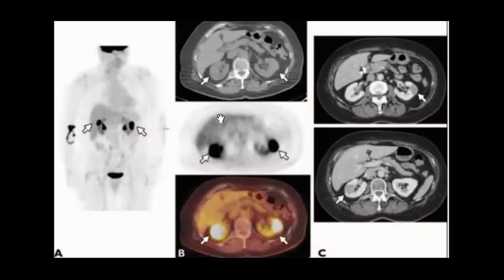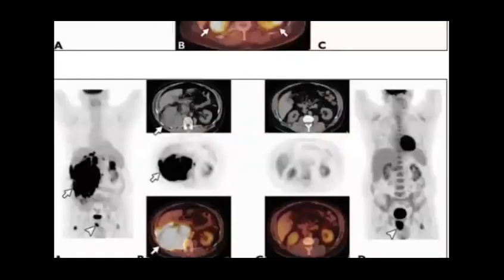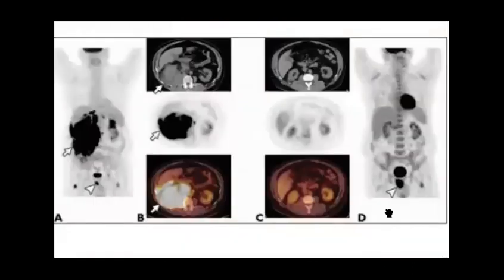Yeah, if you take a biopsy, what do you expect to see? As Rihan told us from the first, with this very high uptake, it can be what is called renal lymphoma. Yes, B-cell lymphoma. It is lymphoma. Yes. Okay.